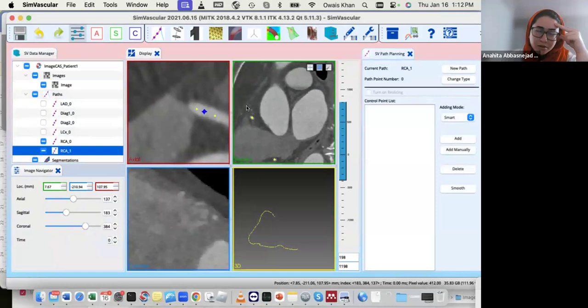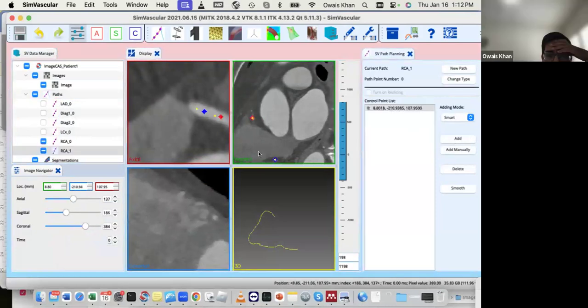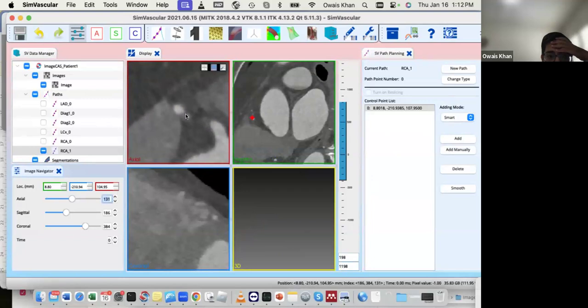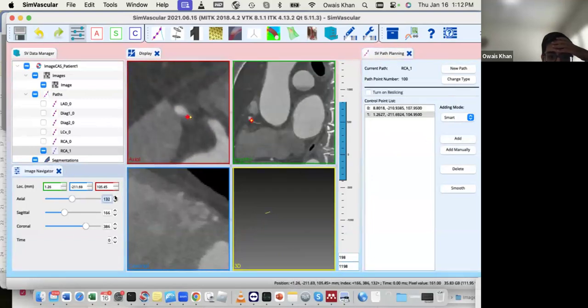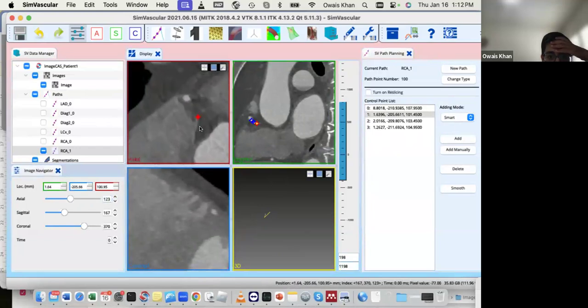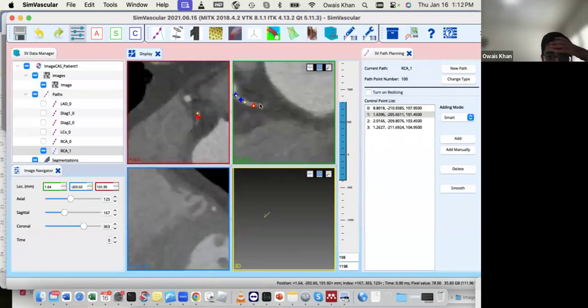And I'm going to add this. This is a non-myocardium branch, right? Yeah, it doesn't supply blood to your myocardium, probably supplies blood to one of your atriums. So atriums we're not so much interested in, but I'll just segment it out for completeness. I don't really care about this small branch right near the ostium. It's not a main branch, so we don't really care as much about it. But because I'm doing it already, I might as well.